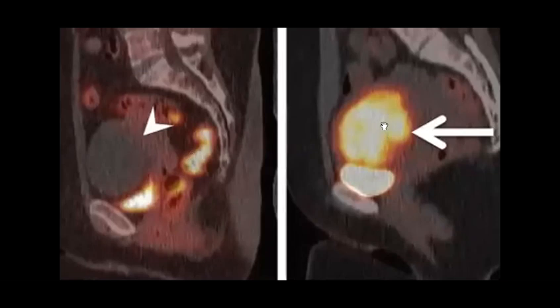So which very common lesion has fibrous tissue, or something similar to fibrous tissue, and comes from the uterus? It will be fibroid. And fibroid, as you know, has many shapes and many contents that make it tricky in the PET-CT: sometimes it has high uptake like this one, and sometimes it doesn't have uptake like this one. So you should be quite careful about the fibroid. Again, it's something very tricky. Okay.